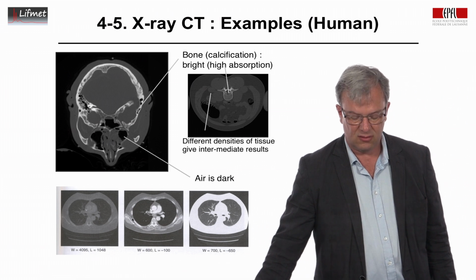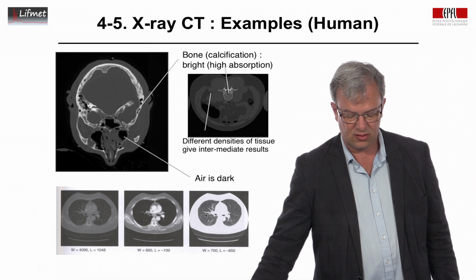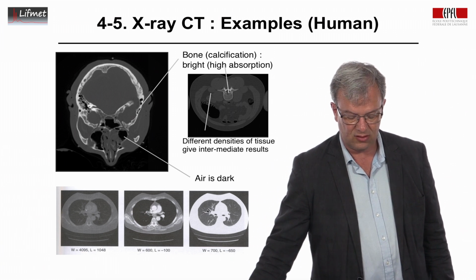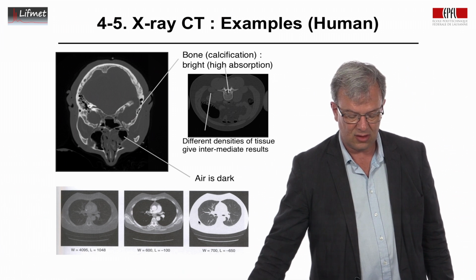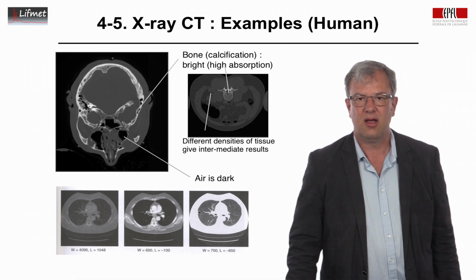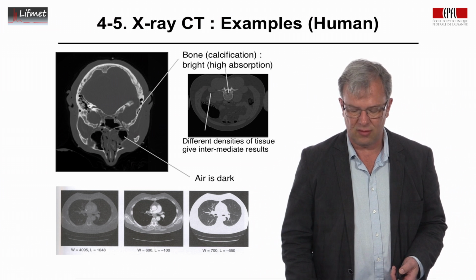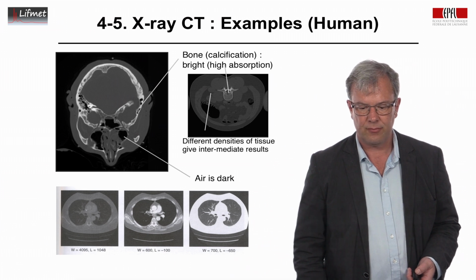And if we want to see soft tissue contrast, we can extend the contrast to see the very low intensities here, and we're starting to see the low contrast here in the lungs, but obviously the stuff that has very high absorption on the outside is now very bright. So we can play with the lookup table of image representation.